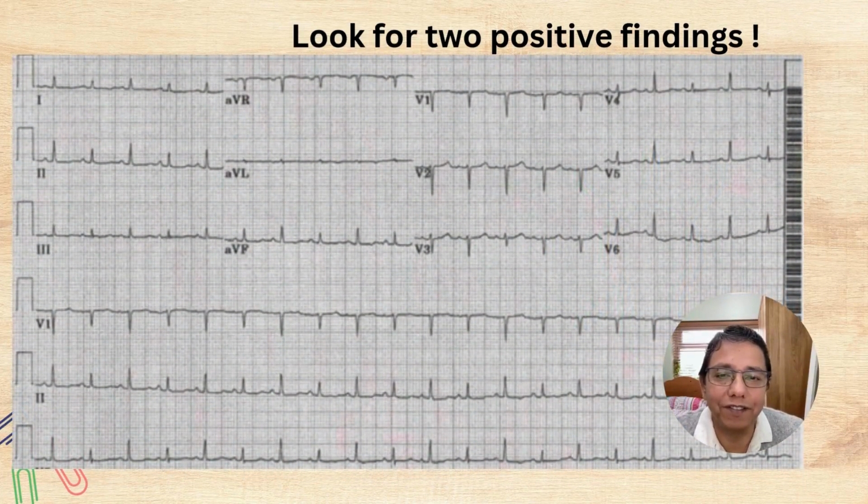After we had seen the X-ray, this girl was called back again as expected, and this was done. So you can see the ECG. Think about two positive findings on this. Let's see whether you can spot them, and then we'll talk about it towards the end again.